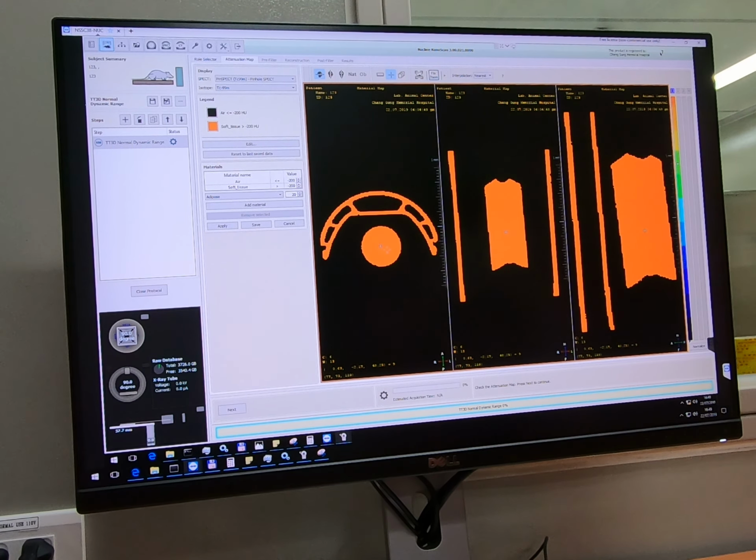If you set it up that way, it will improve the image quality, so there will be no distortion. But I think only in cases like this do you need an advanced material map.